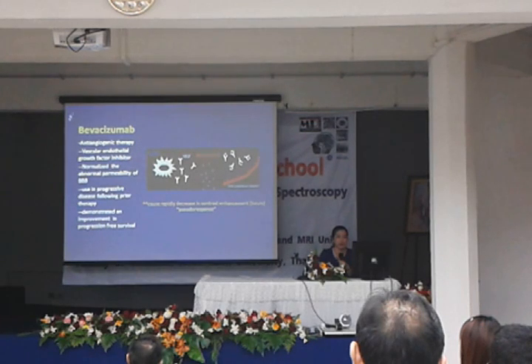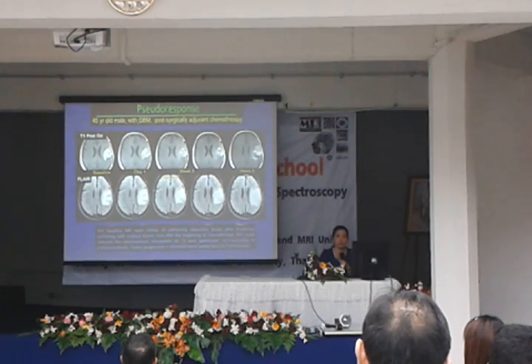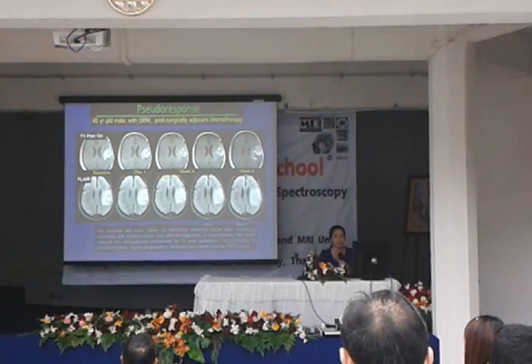Bevacizumab is another new drug. Again, this one can shrink the mass very quickly due to the effect of the drug. But actually, the tumor is still there. If we don't have advanced imaging, we cannot tell. It looks like a response to treatment, but actually it's called pseudo-response.